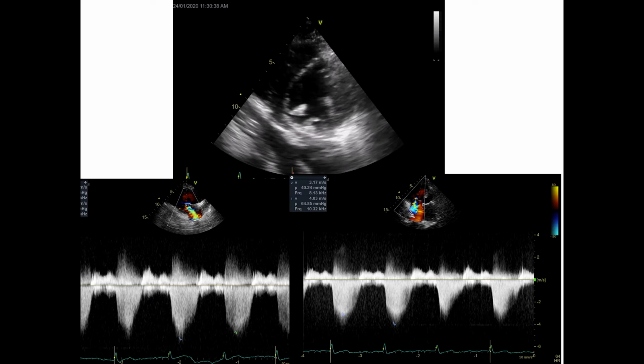This is one of our examples of a patient who clearly has septal flattening and is suspected to have pulmonary hypertension. In this signal, on the left-hand side, you can see that there is an angulation problem such that the path of blood flow is different than that of the Doppler signal, leading to underestimation of the right ventricular systolic pressure. On the bottom right-hand corner, you will notice that the maximum velocity can be estimated, but the example here is that of over-exaggeration due to lack of consideration of the modal velocity. You notice that in this particular example, when compared to right heart catheterization, the velocities reported in this study were in fact overestimated due to those pitfalls identified.